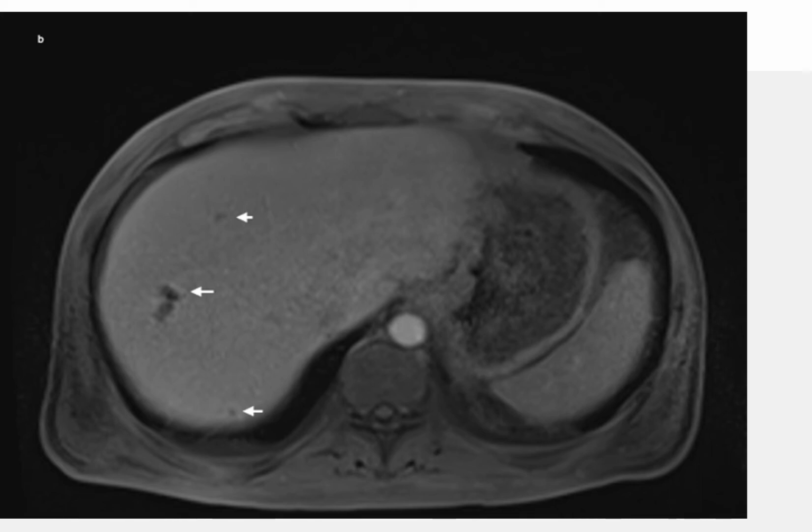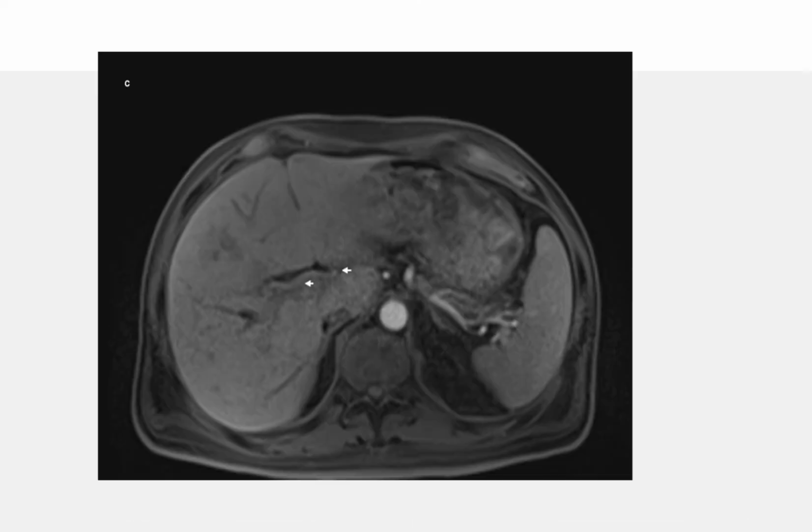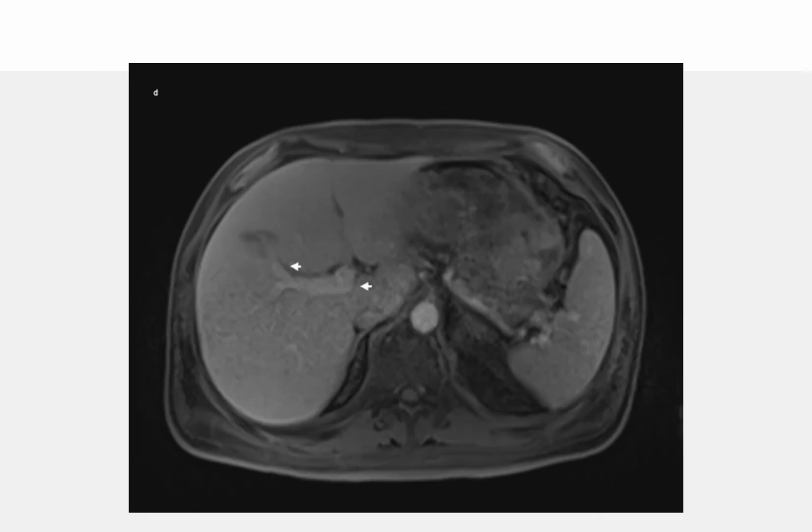As we can see from the other slides here, this is likely due to ketoacidosis and unrelated to the hepatic artery or hepatic venous system. Here we can see on the arterial phase the hepatic artery, which appears patent. And here on the portal venous phase, we can see that the portal vein appears patent as well. And so this likely pointed to ketoacidosis-related infarction.